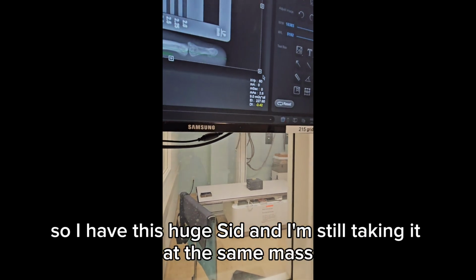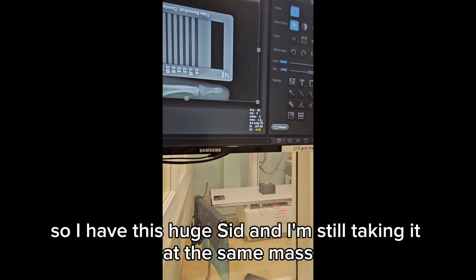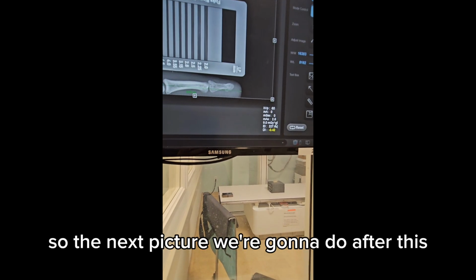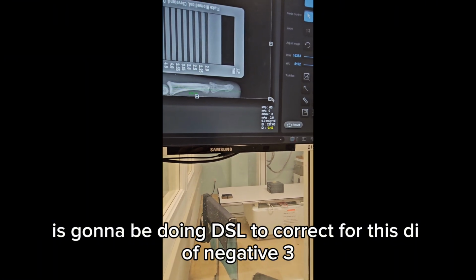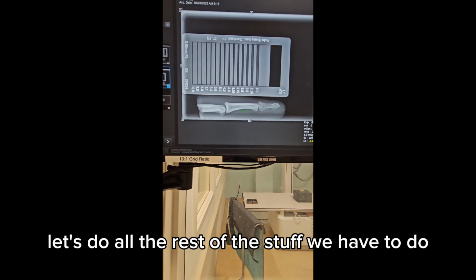So I have this huge SID and I'm still taking it at the same mAs, which means my DI is going to be very underexposed. So the next picture we're going to do after this is going to be doing direct square law to correct for this DI of -3. But in the meantime, let's do all the rest of the stuff we have to do.